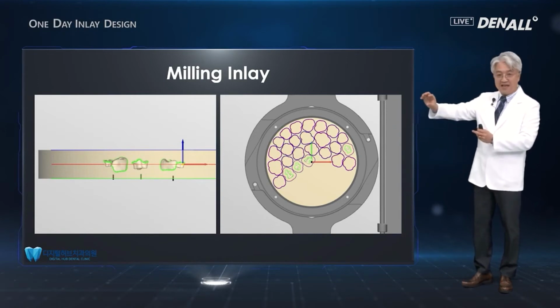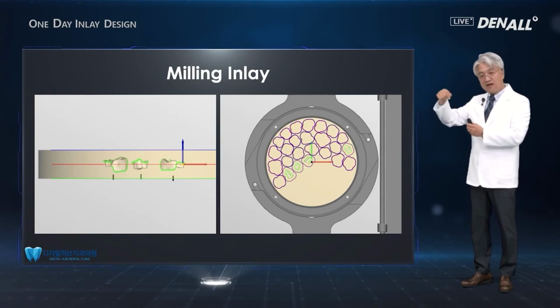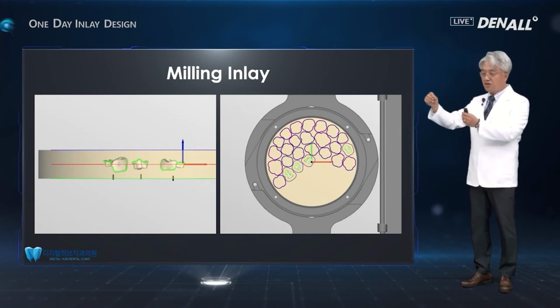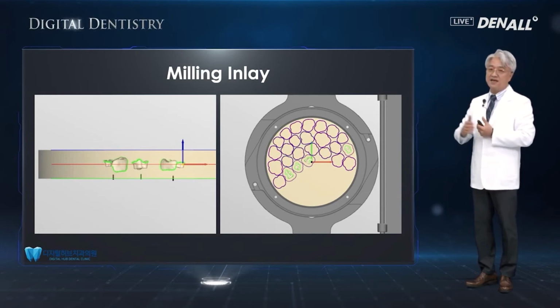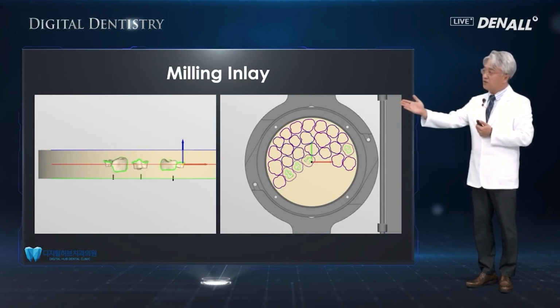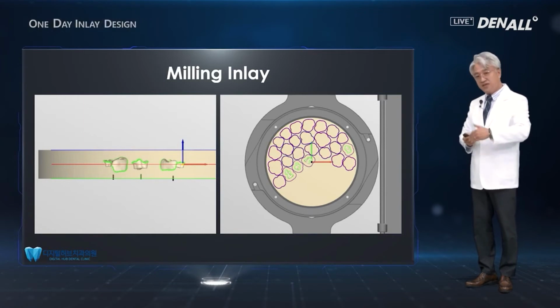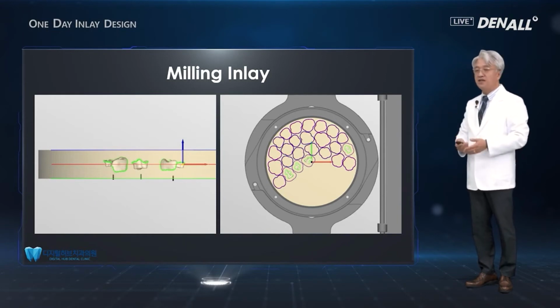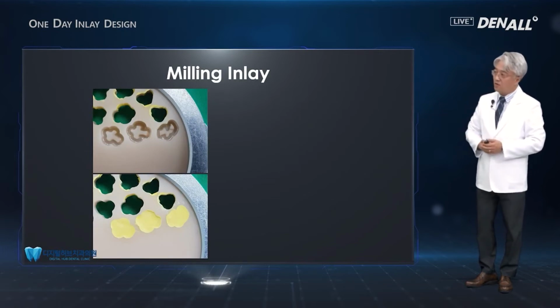So in the disc, where to position the inlays, and using the milling machine when you do the cutting or milling, which burr needs to be used, all this needs to be calculated beforehand. And the software used for that calculation is CAM software. And using the CAM software, the inlay positions are determined, and then the calculated tool path or the values are given to the milling machine. Then you go to the next step of the inlay production.